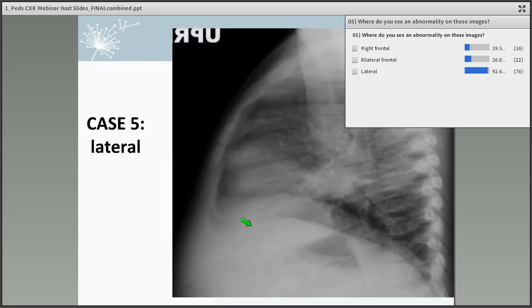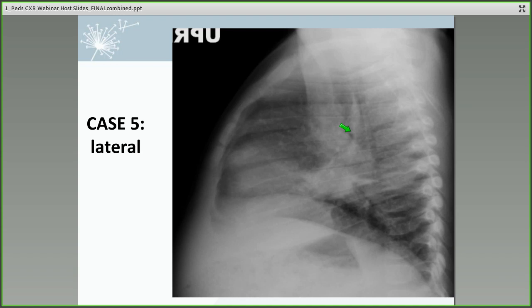So on the lateral chest radiograph, you see focal opacity. It looks like it's involving more of the right middle lobe area. Now again, as we come down on the trachea, you see that the trachea is narrow at this point, and it looks like there's extrinsic compression from peritracheal adenopathy, as well as hilar adenopathy. All this increased density, maybe even infrahilar. So this is definitely consistent with hilar adenopathy and focal consolidation in the lung. And I would be very concerned for possibly TB again.